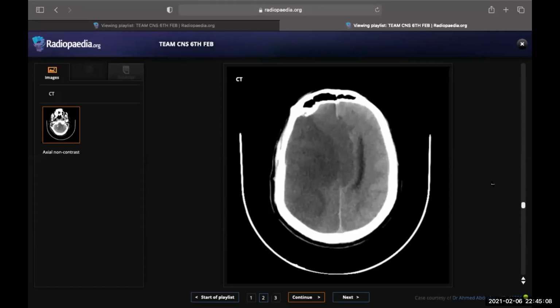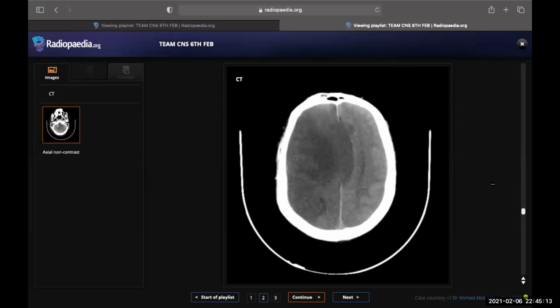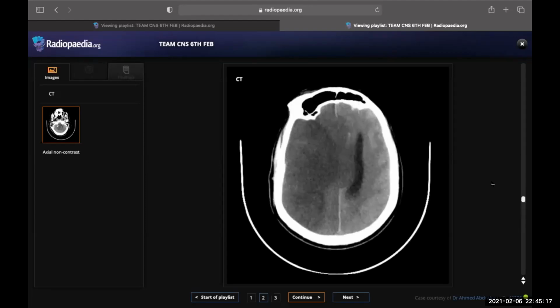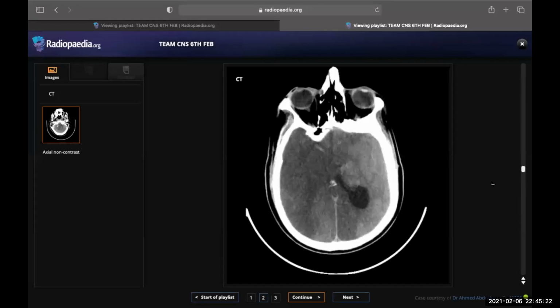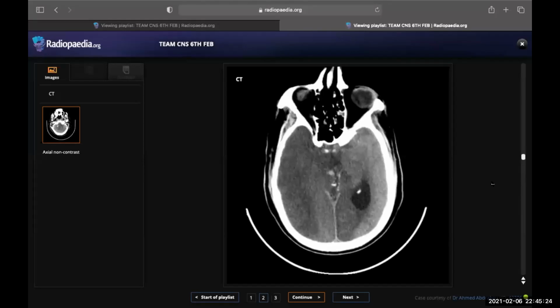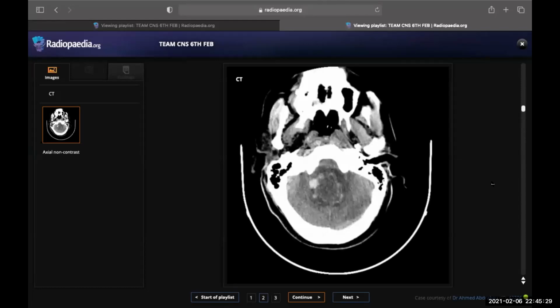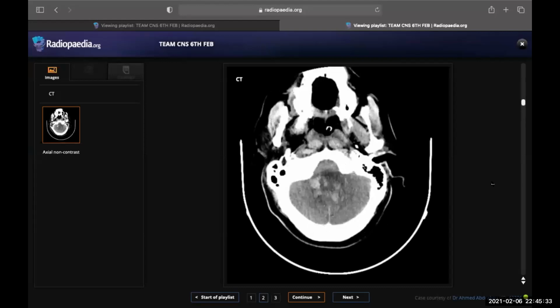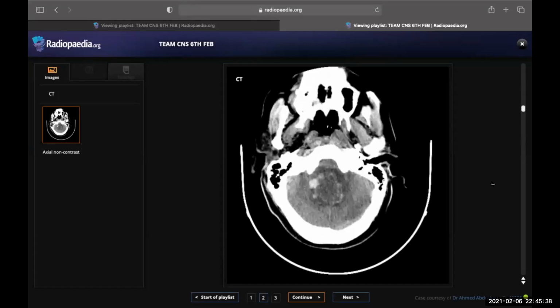Okay. So what sort of herniation is there? Can you explain? I don't recall the name. No problem. You can describe. The problem is that I don't have any coronal or sagittal reconstruction. Yes, there isn't. I'm being the mean FRCR examiner who just wants you to diagnose everything on this axial. I don't have anything else for you. Uncal herniation. Good. And with the secondary infarction.